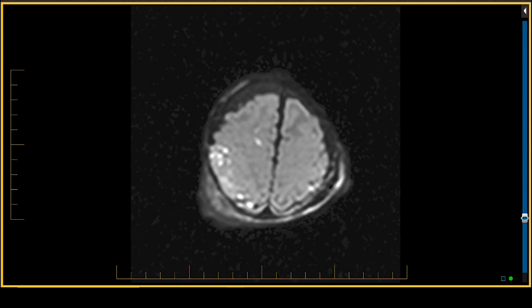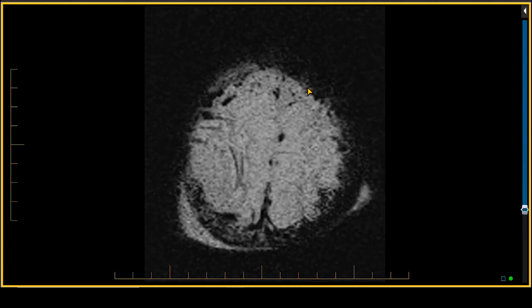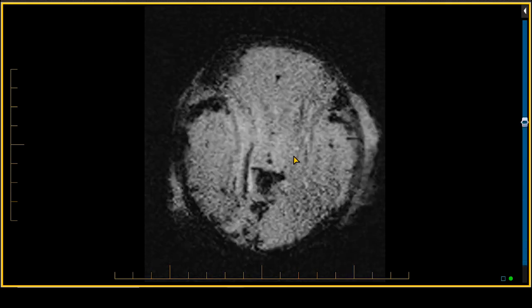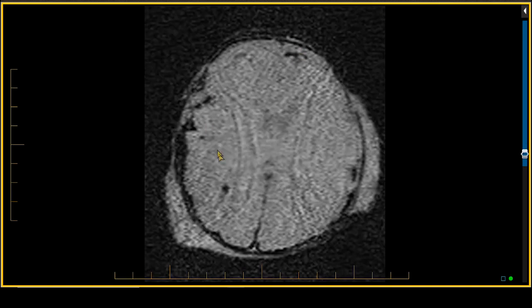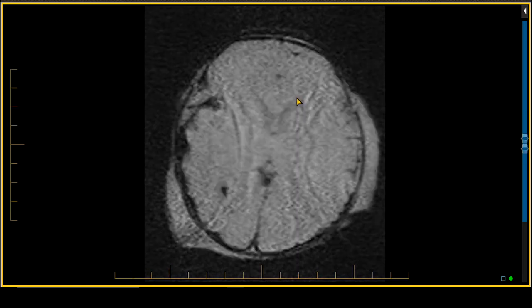However, the susceptibility weighted scans will show the degree of hemorrhage. Unfortunately, the patient was moving quite a bit. However, I hope that this scan can still impress you with the amount and number of hemorrhagic injuries to the brain from the shearing injury that the child sustained. We tried it multiple times. You see all these little black areas which represent the deoxyhemoglobin of hemorrhagic shearing injury.